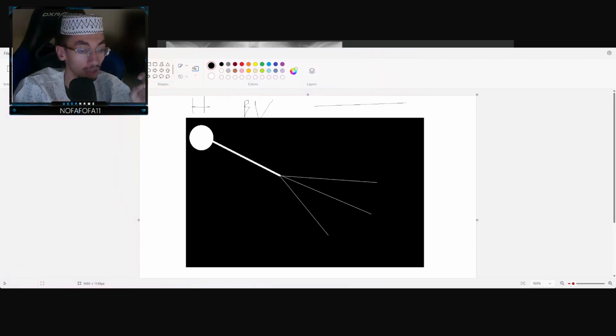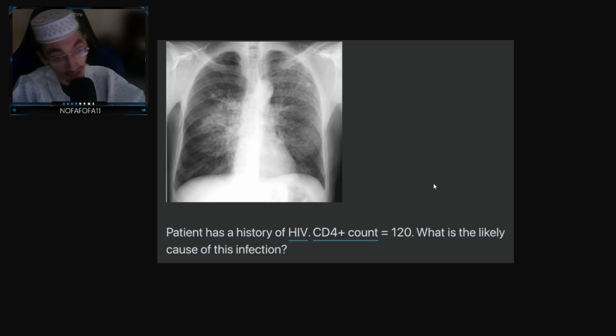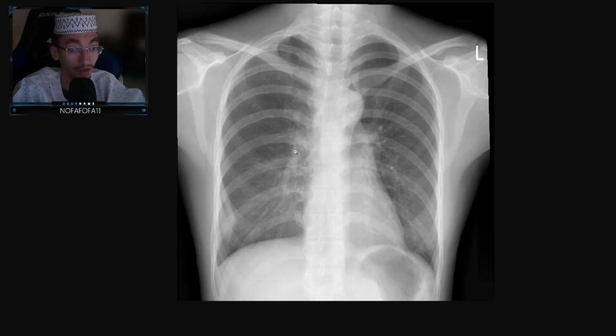Now, if we come back, we'll see what we mean by that. Here we will find that we have the alveoli and the bronchioles, which are composed of air, and we will find the pulmonary blood vessels. You'll see they're very prominent. They're prominent in the center, but they're also very prominent towards the periphery, as compared to this normal finding, right?